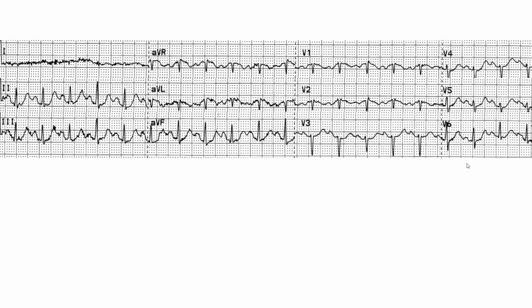Yes. So I just want you to think when you look at this EKG, yes, this is very possibly an anterior infarct. But this could also be COPD, where the heart is swung posteriorly. Hence, you have prominent negative forces throughout all of the precordial leads or most of them. And that's why with COPD and lung disease, you will get a right axis, because the heart is swung vertically. And that would explain the right axis. Typically, you shouldn't get Q waves, but on occasion you can get Q waves in the lateral leads, especially in lead AVL. You can get a Q wave in lead AVL in patients with a vertical heart.